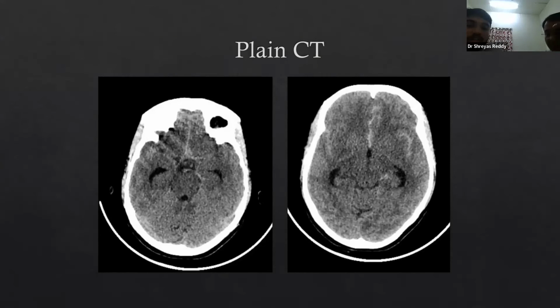Okay. What other thing do you see, whenever you are seeing a patient of SAH? We must always find out the cause of the SAH. What is it in plain CT only? What do you think? What do you see in the image? IVH. Rule out an IVH. And what is the CT grading criteria for Fisher's grading? Fisher's grading includes less than 1 mm, more than 1 mm, with IVH or without IVH.